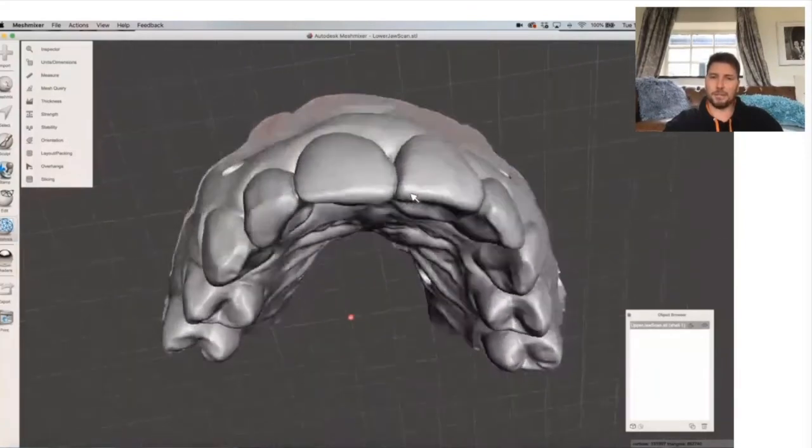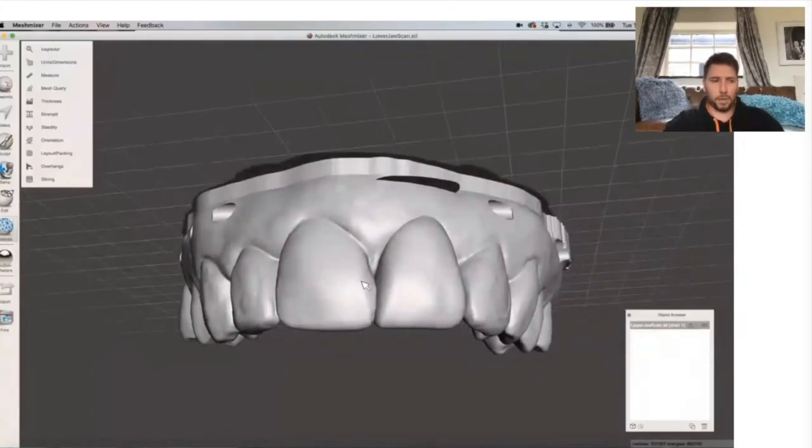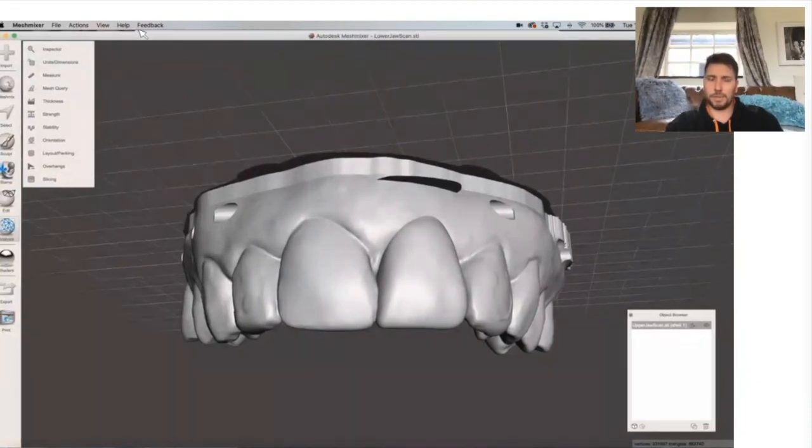I'm going to take my bite and everything else from the teeth as they are now, because my personal preference with everything, when I'm doing veneers or crowns or whatever, is I always rather the occlusion to be conformed to as much as possible. And if you want to know more about digital occlusion, then Hossam Dow is doing a lecture, and he's your man for that.